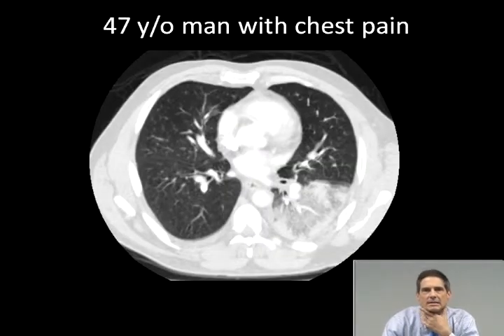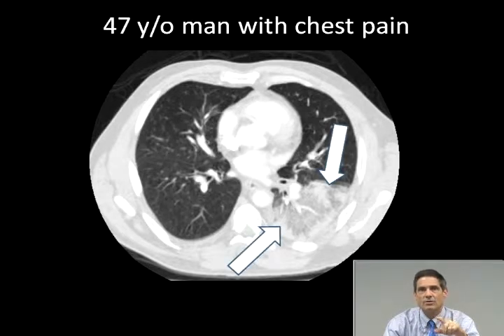He did get a CT scan. Here you can see a combination of consolidation and ground glass opacity. Radiologists use the word consolidation, meaning on a CT scan, lung density that obscures the lung markings and vessels. And then they use the term ground glass opacity for increased density that is greater than normal lung tissue but less than consolidation, and which in general does not obscure the native lung markings. Here are two arrows showing that area of combined consolidation and atelectasis.